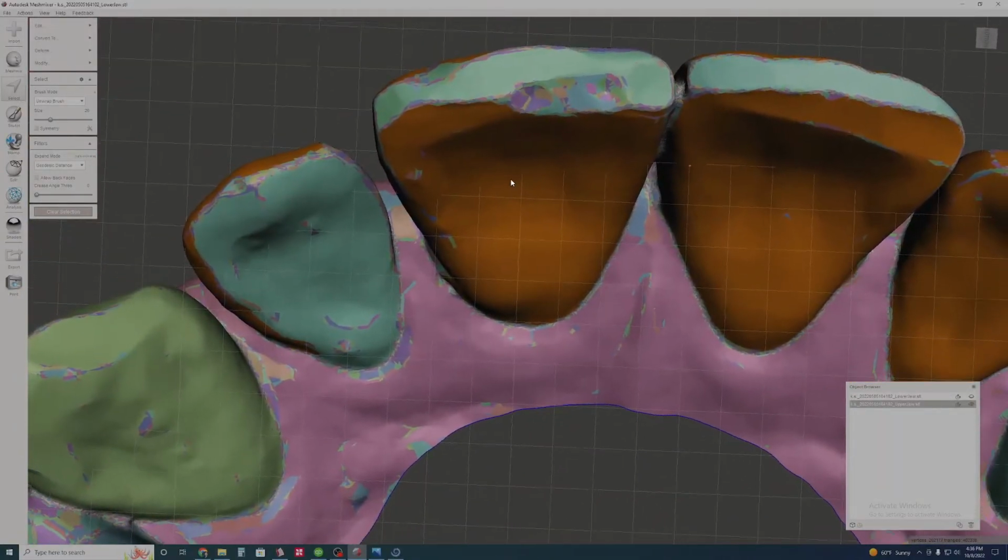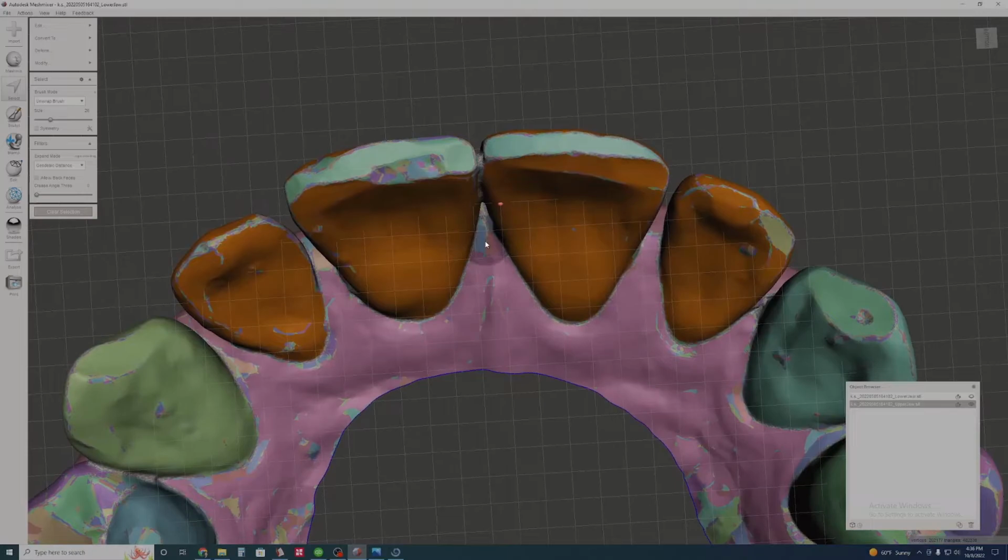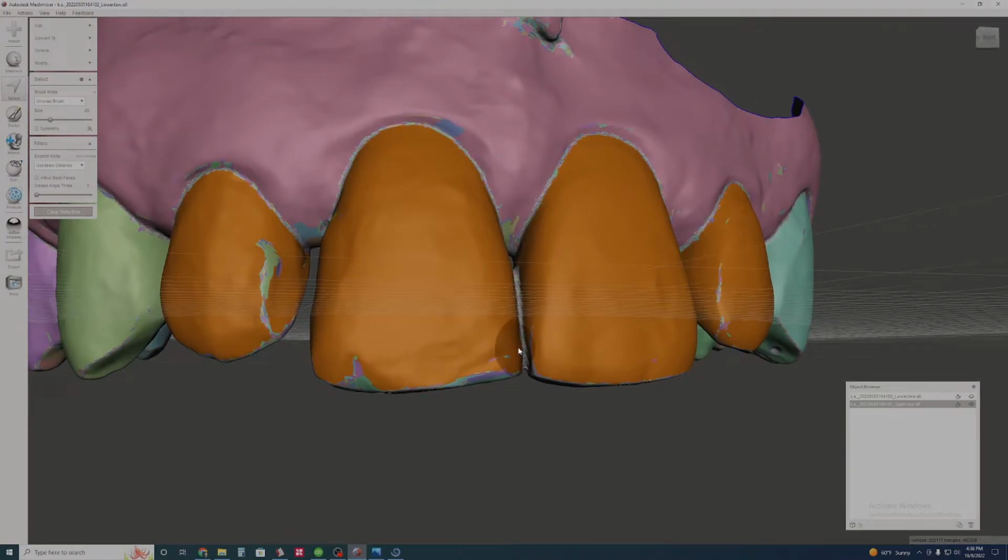A trick that I learned, I can't remember if it's Baron Grutter or Dr. Corey Glenn, but you can hold down Shift and hit the greater than button, and you keep track of how many times you've hit that. So I'm holding Shift and the greater than, and I'm going to count how many times I'm doing this. 1, 2, 3, 4, 5, 6, 7, 8, 9, 10, 11, 12. Why not? Now I'm going to go backwards 12.